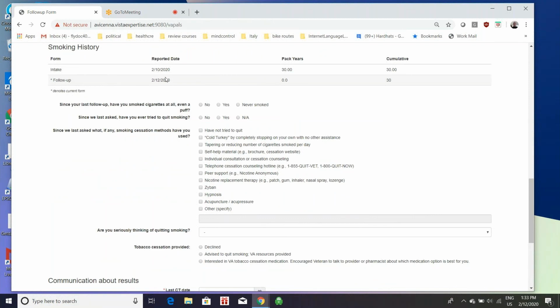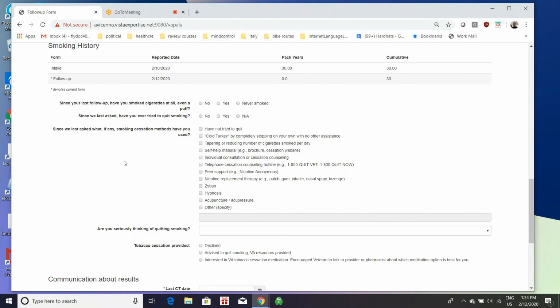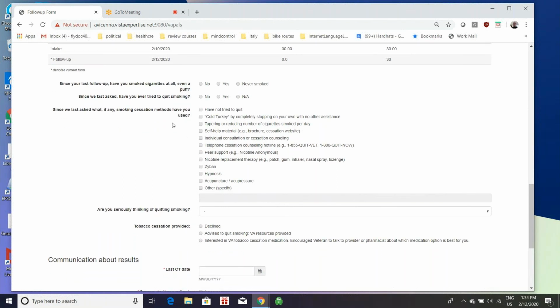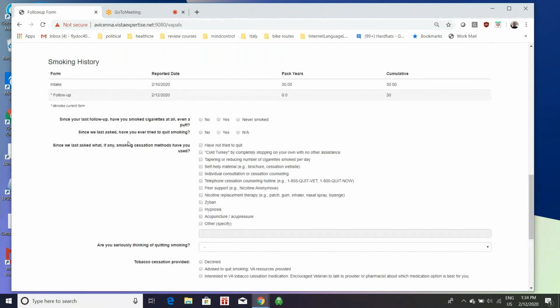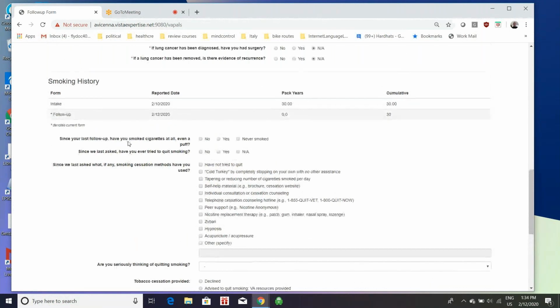Now, if this had been a while, and we filled this in, you would see that this would automatically get calculated and put in here for us. So the math is done, which is very nice. So let's comment right on that table, because people are enrolling in this program for multiple years. They're going to be scanned annually or more often over multiple years.